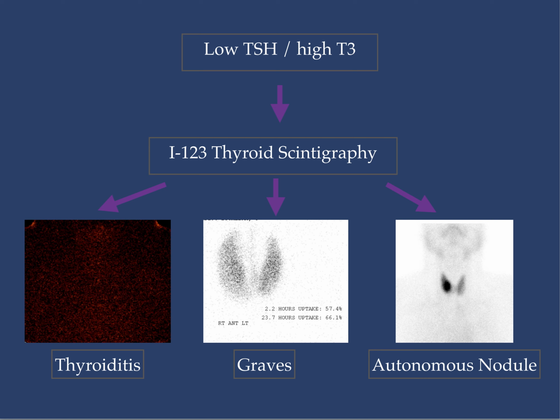All right, I'm sure all of you got this right, and the image on the left side of the screen is thyroiditis. So we see absolutely nothing, no uptake, and this is when thyroid inflammation causes spillage of thyroid hormones. So we're going to have an oversupply, and that's going to be transient. So if you see this, the endocrinologist just needs to wait it out.